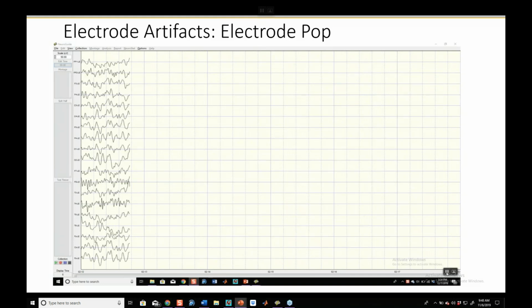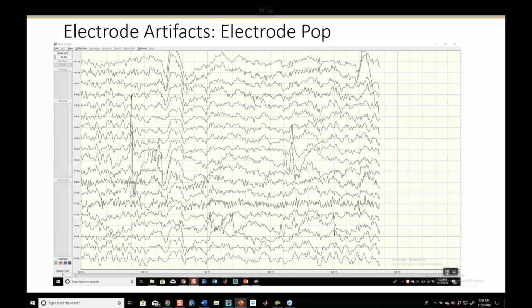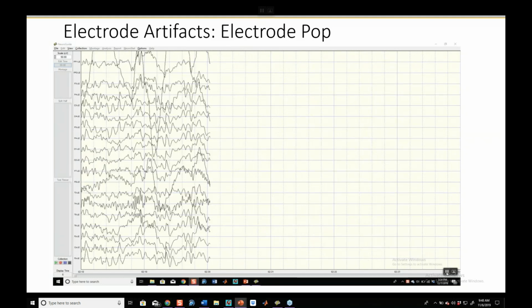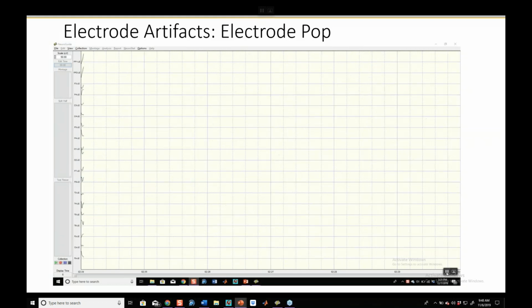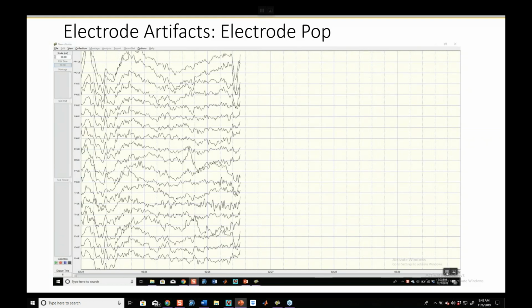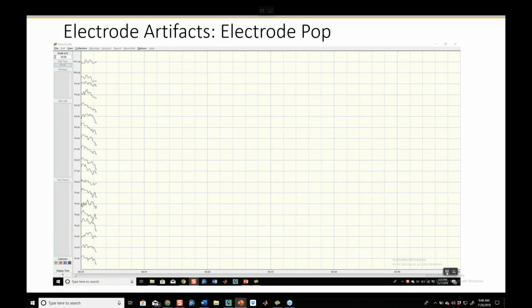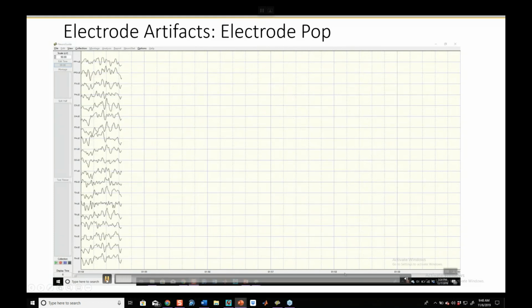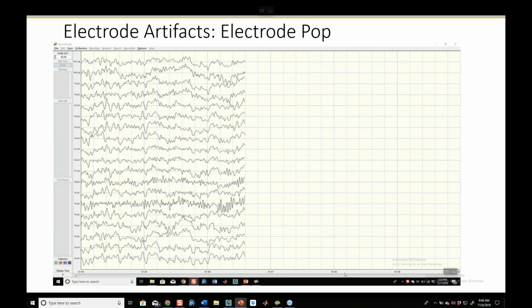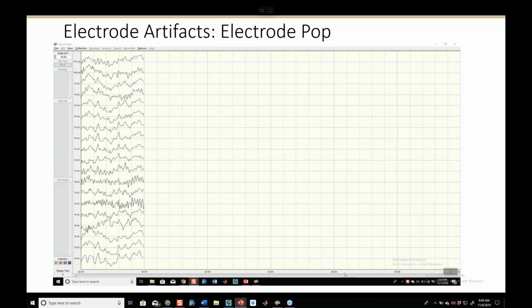And so, yeah, as a clinician, your first thought, especially if you're not super familiar with raw data, is you may say, oh my goodness, do we have a seizure here on our hands, right? We have this loose popping electrode. And you don't. That's the good news. You don't have somebody that's showing any epileptiform discharge. That has field and phase, right? That's multiple electrodes doing the same thing.